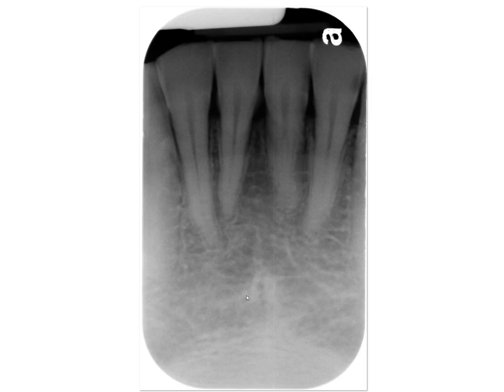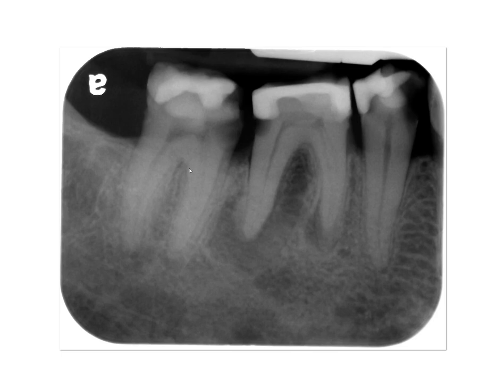This opacity represents the genial tubercle, and this tiny little circular radiolucency within the center of the opacity represents the lingual foramen. But keep in mind that they don't always have to be in the center of the genial tubercle, but often they're very close to one another. Over here we can see the inferior cortication of the mandibular canal and then the superior cortication of the mandibular canal. This area is very radiolucent, consistent with the submandibular gland fossa or lingual undercut.